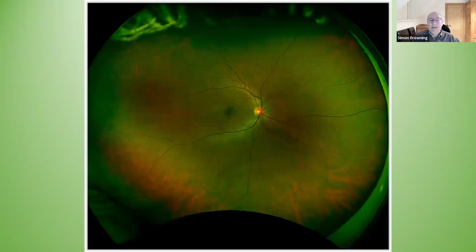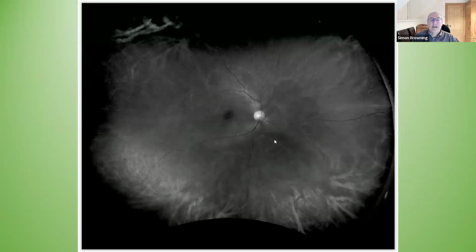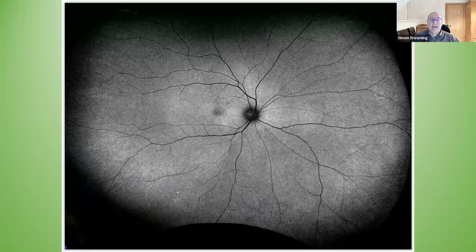Again, it's not that specific when you look at it, but you will see the lesions in the centre and lesions around the edge here. I've thrown that one in because I had one of those in my practising life and I wasn't sure exactly what I was looking at. The referral brought it in.